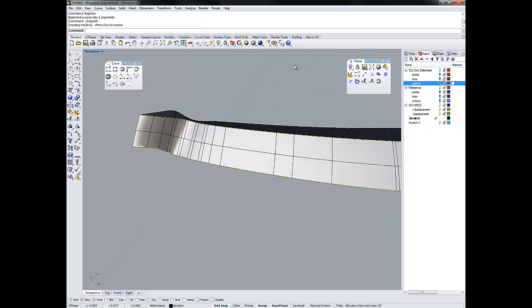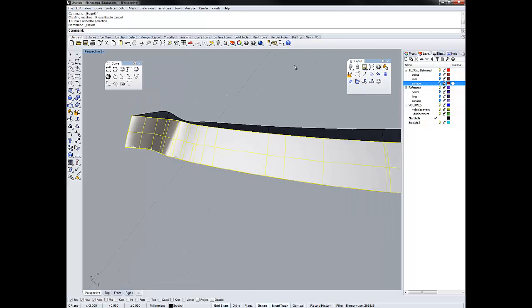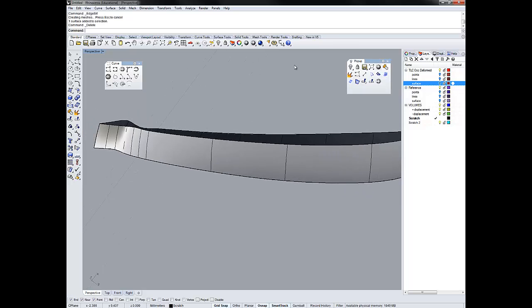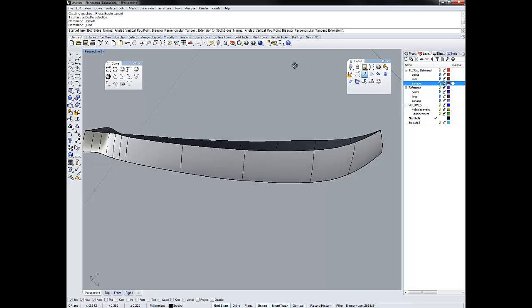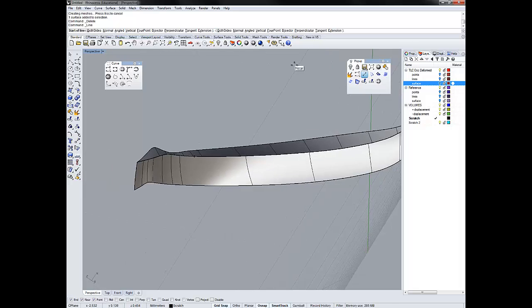And so we're going to try and break this down into a smaller problem. So I'm going to delete that, and I'm going to draw a line from here to here, and then I'm going to just make that as one surface. So for this, I'm going to use just one line segment, which is in the pop-up menu. I select line, I rotate so I can see it, and then I'm just going to go near and then near.